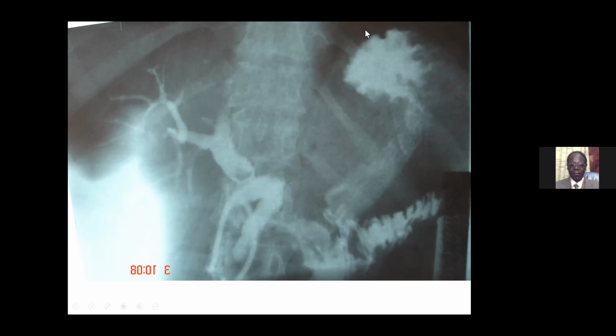This is the fundus of the stomach, which in a supine position is the most posterior part, the lowest, and therefore contrast will go towards it. And peristalsis will push the contrast through the duodenum, the C-loop, all the way to the jejunum. So this is part of the jejunum. This is normal physiology. So this explains why we are seeing contrast in the stomach and the jejunum.